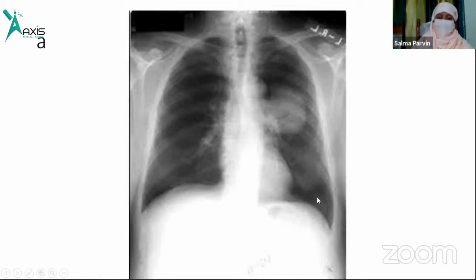So this is a simple presentation and the very well-known presentation of the mitotic lesion. Undergraduate students will be able to read such a large lesion. There is no possibility to miss such a big lesion as mitotic. A very simple thing for you, everybody, I think.